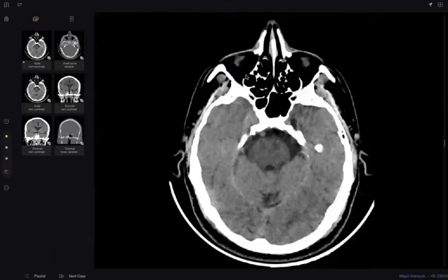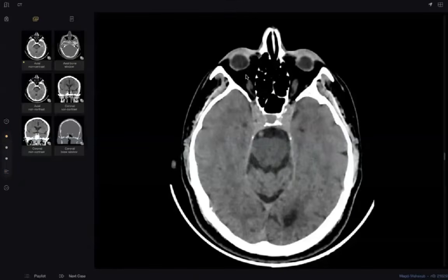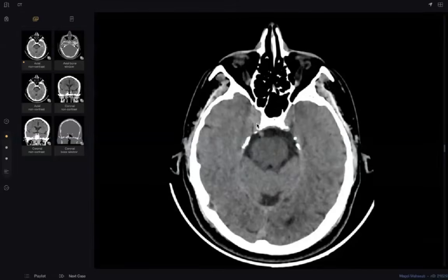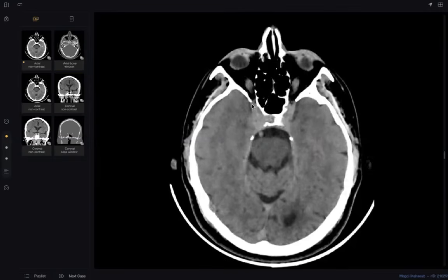What happened here, my colleague? When the examiner gives you any sequence, almost 99% this sequence has many findings. Squeeze the sequence till the end. Here, if you look, there is some soft tissue, or at least asymmetry between this cavernous sinus and here. Even the bone on the left side here is not seen. So there are some distractions. So go up and down around this lesion. Even this is non-contrast. If you look here, here is more hyperdense than here.